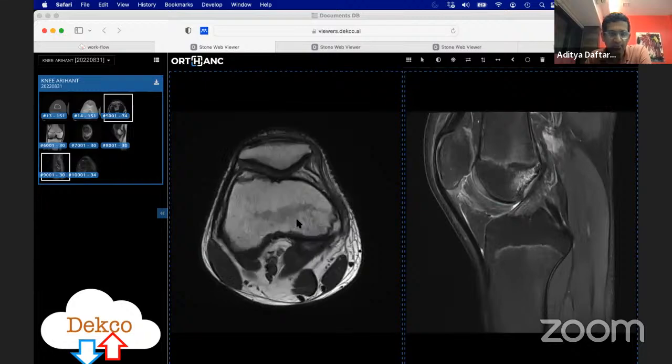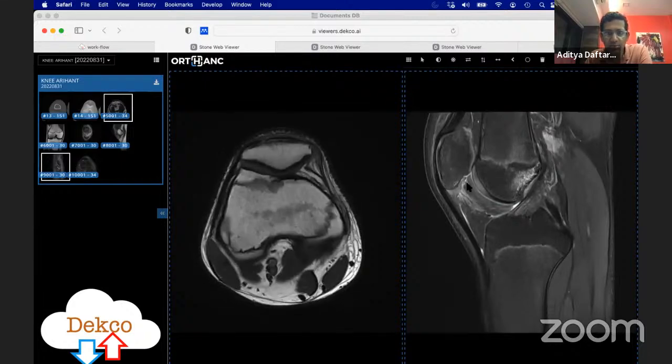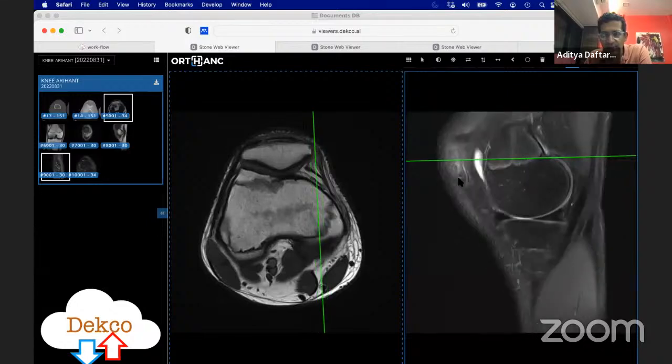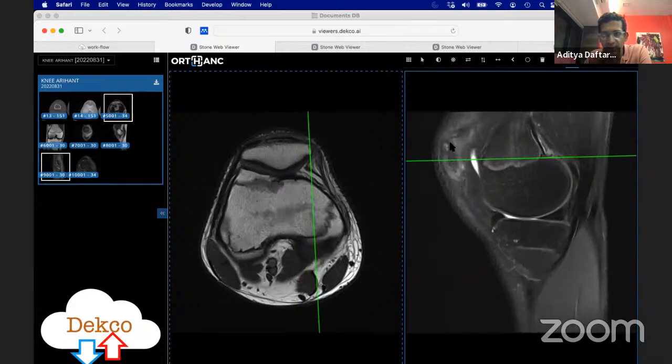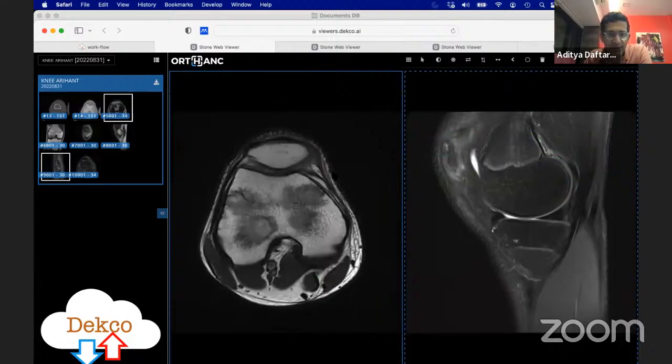You can see that on the femoral side as well. And you can see here, this is the patella. As we scroll across in this case, this is the inferolateral patella. This is the patellar attachment. So we're coming more laterally here, I mean, sorry, medially here. So this is the medial patella. You can see as we scroll up and down here, this is actually the MPFL.